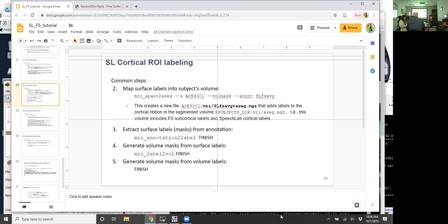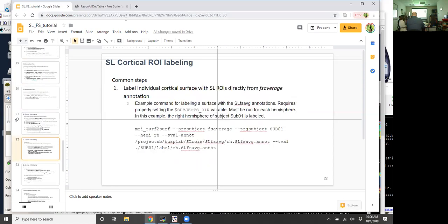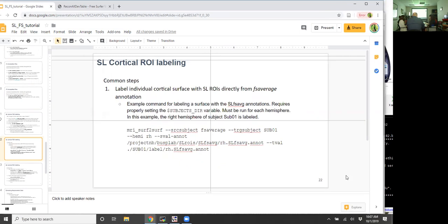Is this recording? Yes. No? Okay, so I'm going to be flipping back and forth between this and the VNC window. So what I may try to do is make this as big as I can, and still be able to get over that window.